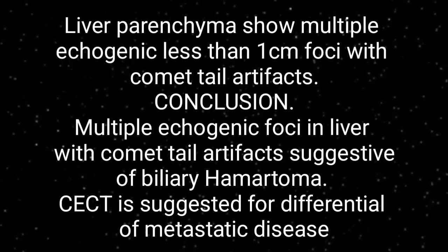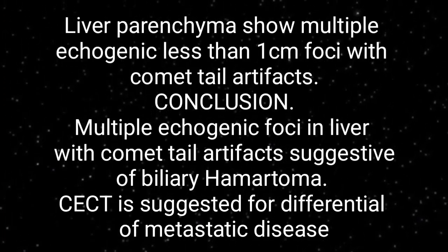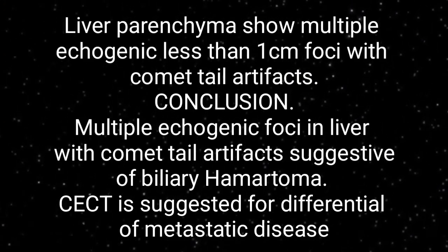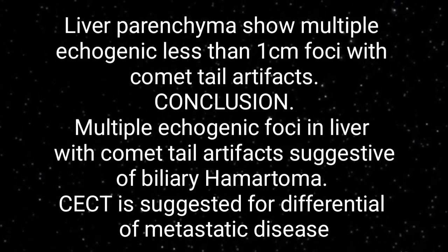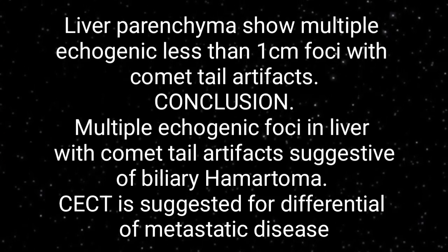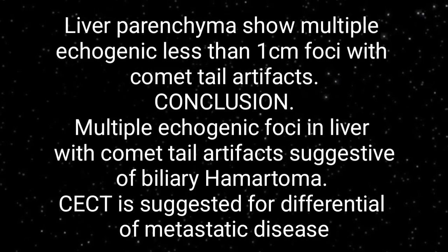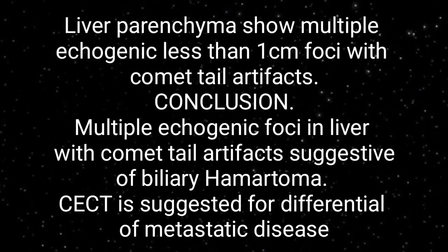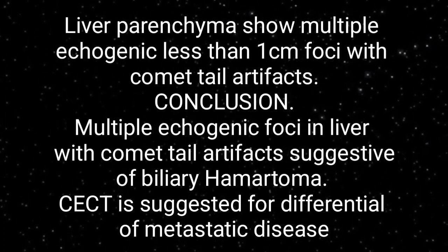On the report mention that liver parenchyma shows multiple echogenic foci less than 1 centimeter with comet tail artifacts, and in the conclusion mention that multiple echogenic foci in the liver with comet tail artifacts are suggestive of biliary hamartoma. Also mention that contrast enhanced CT, CECT, is suggested for differentiation from metastatic disease, because on contrast enhanced CT these liver hamartomas will appear hypodense.